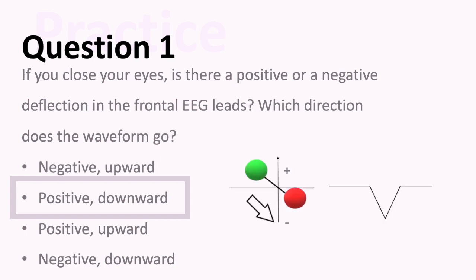Here's the model. Remember, if the first electrode is positive, then it will go in the direction of the second electrode, or downward. And again, I think of these kind of weights in a Cartesian plane that then go slant downward, pointing downward if the second electrode is negative.